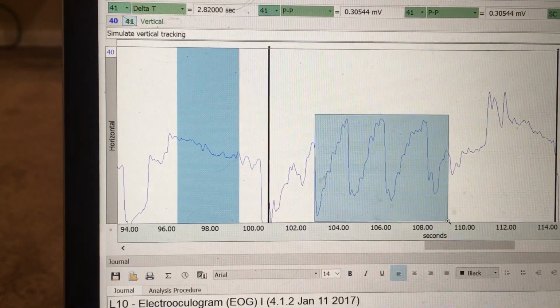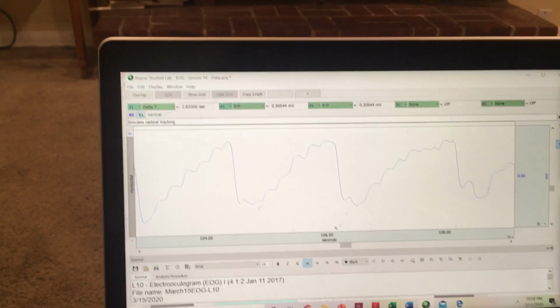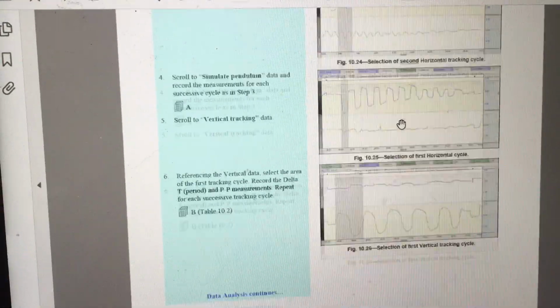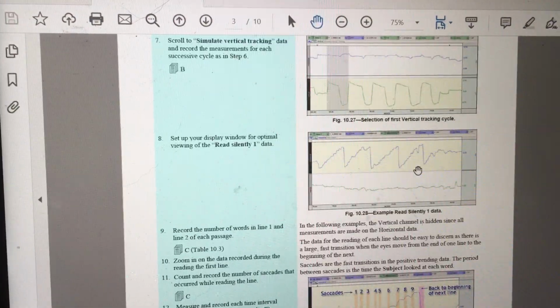And I can see here those three peaks are representing the tail end of some sort of pattern. So I zoomed in on those so I can look more carefully. And now you have to flip back and forth quite a bit to your lab manual, where it's going to be telling you what to highlight. Now, up to now I was kind of telling you. This is of particular importance.